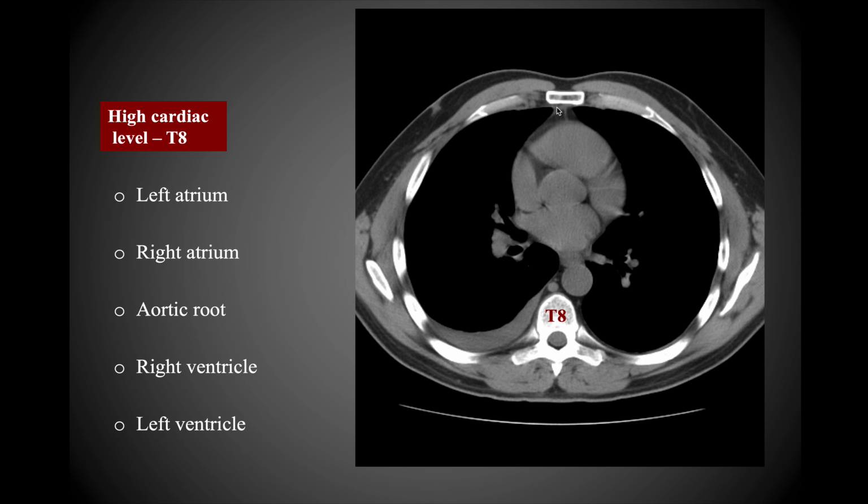And then you can see the right ventricle anteriorly, and then you don't really make out the left ventricle very well, but you'd start seeing it kind of over here in this region right here. So again, you can see left atrium, right ventricle, and then again, left ventricle would be showing up here shortly, ascending aorta or the aortic root. And then back here we can see the descending aorta next to the azygous vein. And again, this is the T8 vertebral level. And then over here you can actually make out some of the bronchi that are, again, segmental bronchi as they're going into the various bronchopulmonary segments of the lungs.